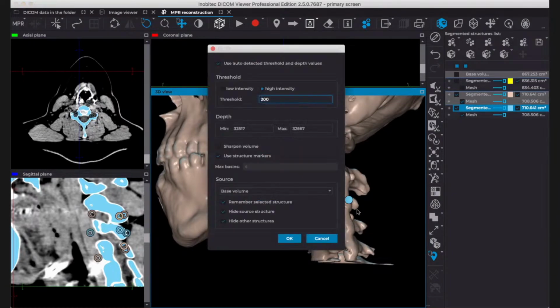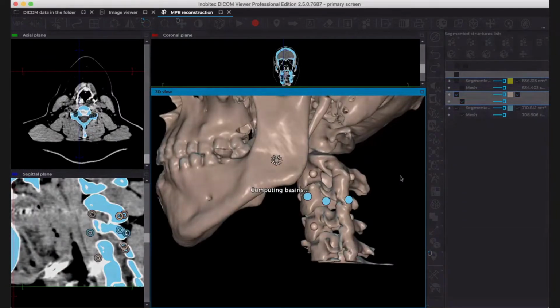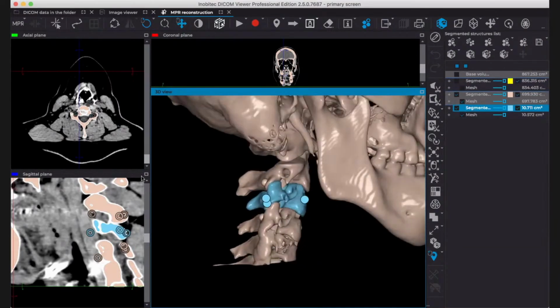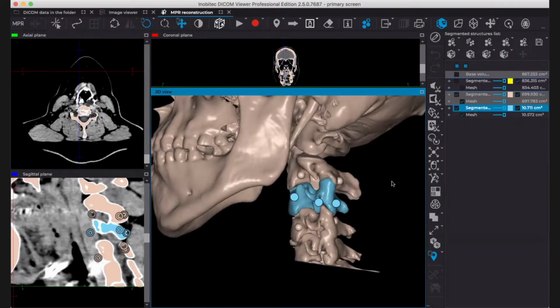And we click over this icon, just say OK here. We wait a little bit and you see, works perfect. Silvina, sorry to interrupt you. Don't forget that you can rename the segmented structures for visual comfortability. I will. So now we have this separate vertebra.